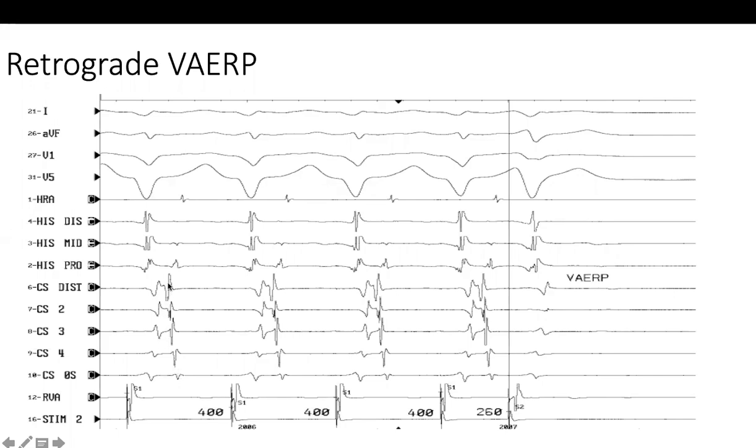from the coronary sinus. Is it sinus? Sorry, coronary sinus. Yes. Started from distal to proximal. Distal to proximal. Oh, this is very interesting. Which means that it is a left side accessory pathway. Okay. Left side accessory. So this means that you have an accessory pathway in the left side of the heart. Yes. Conducting ventricle to the atrium, and when you pace the ventricle, you conduct back to the atrium through that accessory pathway, and the first activity was recorded in the left side atrium.